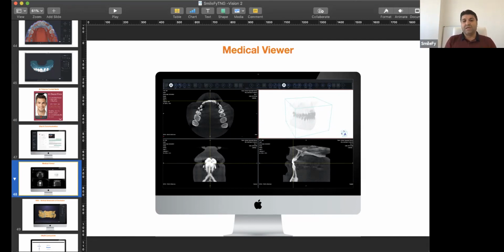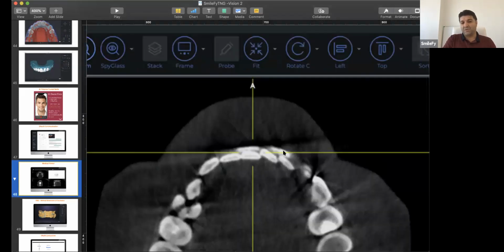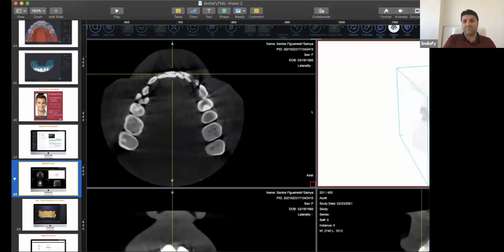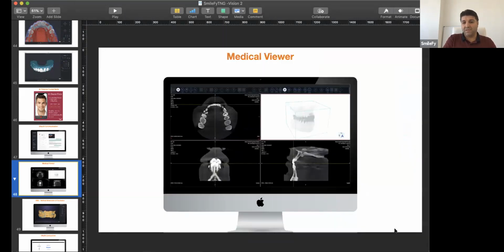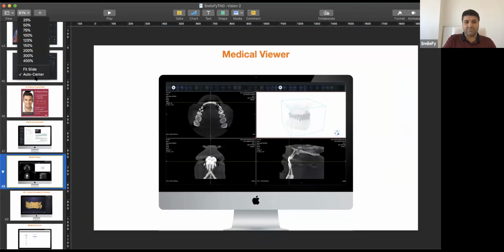And when you design, for example, veneers, that's something that I liked very, very much. When you design your lowers and the veneers, you can see that the lowers overlap with the uppers, and then you know exactly what the treatment can be. And that's also a very, very important help to start from the very beginning with a very accurate design and planning.